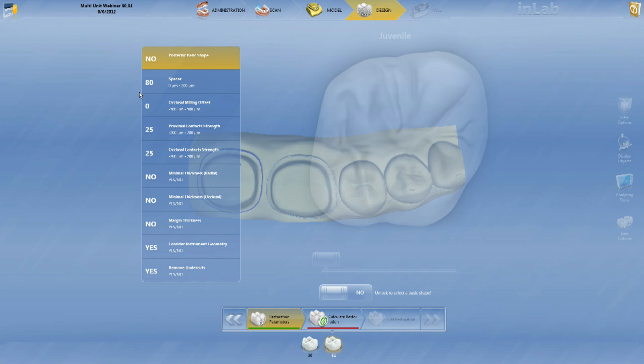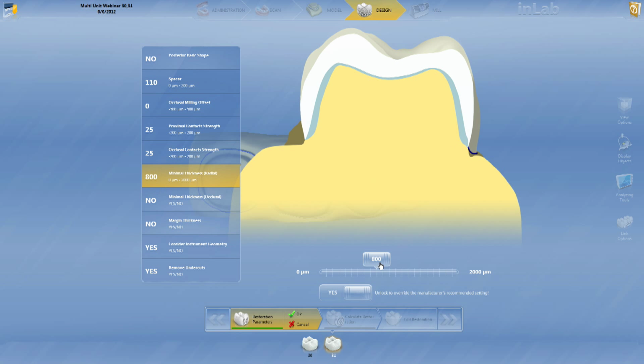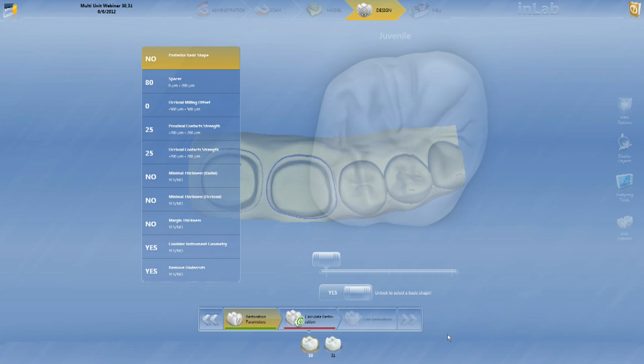Again, Jay went over all the parameters and stuff like that, but we've got so much to cover here, and I'm just going to work on whatever parameters I'm going to use right now. So let's work a little bit on the thickness. All right, and we're going to do the same thing.